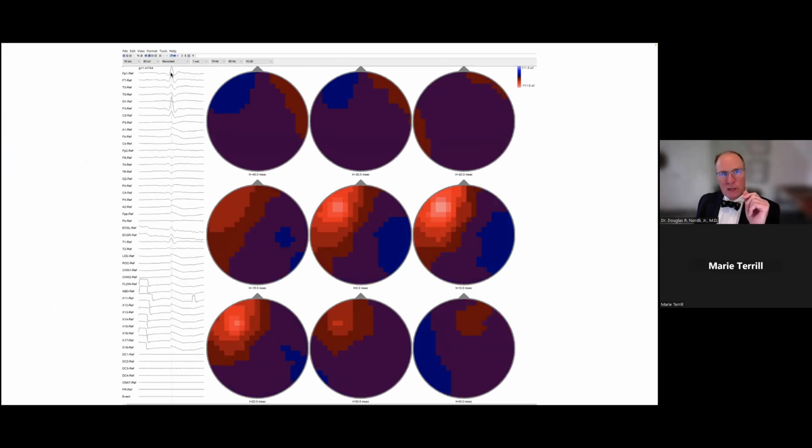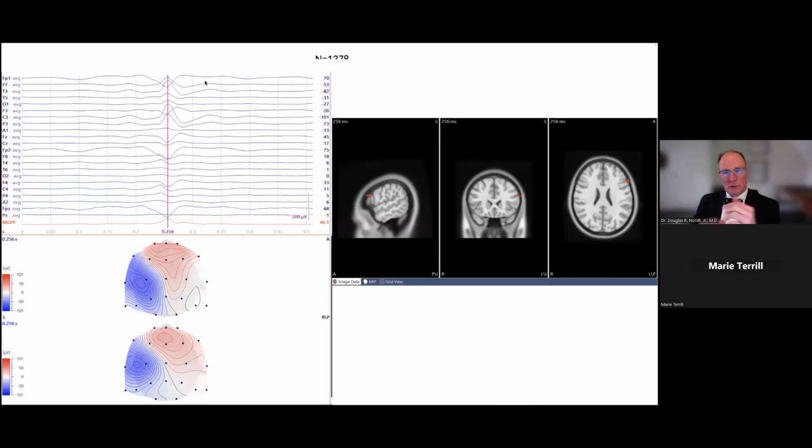If you convert it to the AMP recorded montage over here, then you can easily export this as a text file. And then we use Curry. You can import it into Curry. You just have to turn off the first two channels because they're going to be an arbitrary annotation for the number and then also the time, of course. But then you can input it into your EEG source localization.